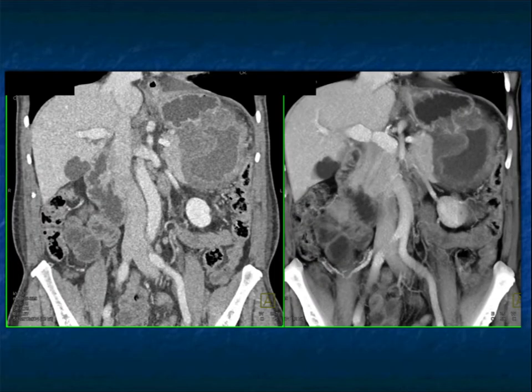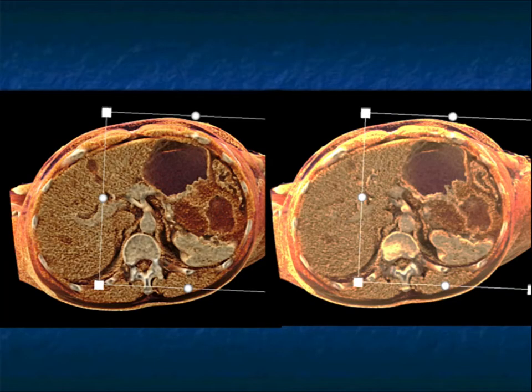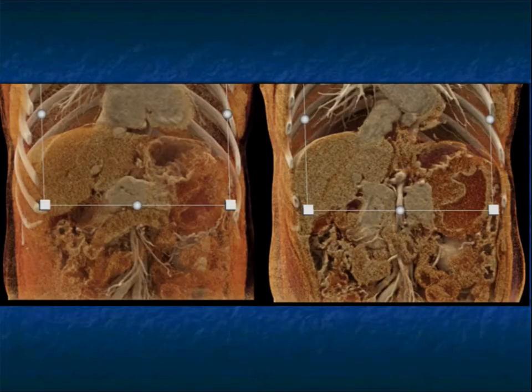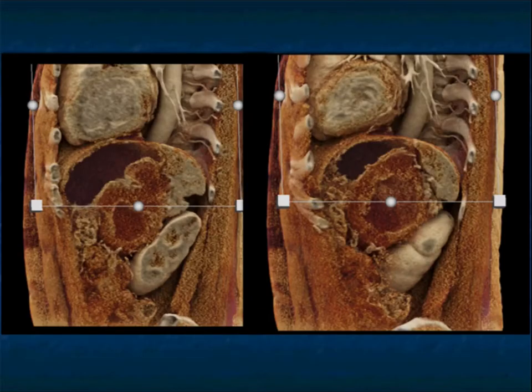This is the patient at presentation. And again, just to remember, these patients present with GI bleeding, ulceration, abdominal pain. Of course, incidentally, they can present, but here's the ones that present with clinical presentation. Just a very, very nice example of that. Here's that same patient with the cinematic rendering, the large exophytic mass, the areas of necrosis you can see here, and then the communication with the lumen of the stomach right here. Okay, so a big exophytic mass which grew in and ulcerated, and the patient presented with GI bleeding.